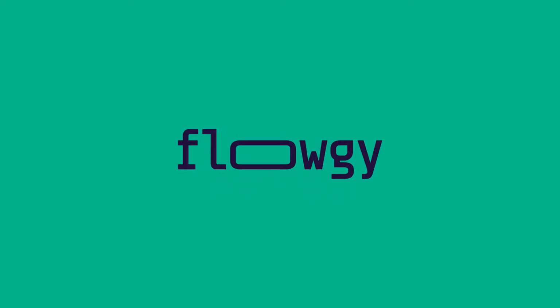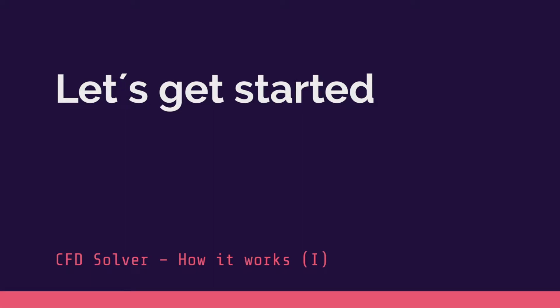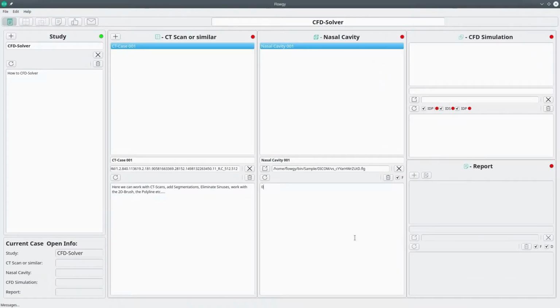Welcome to Flowgy. In this video, we will show how to work with the CFD solver. Once we have done the segmentation of our CT scan, we can continue with computational meshing of the nasal cavity. For this, we have to open our nasal cavity.